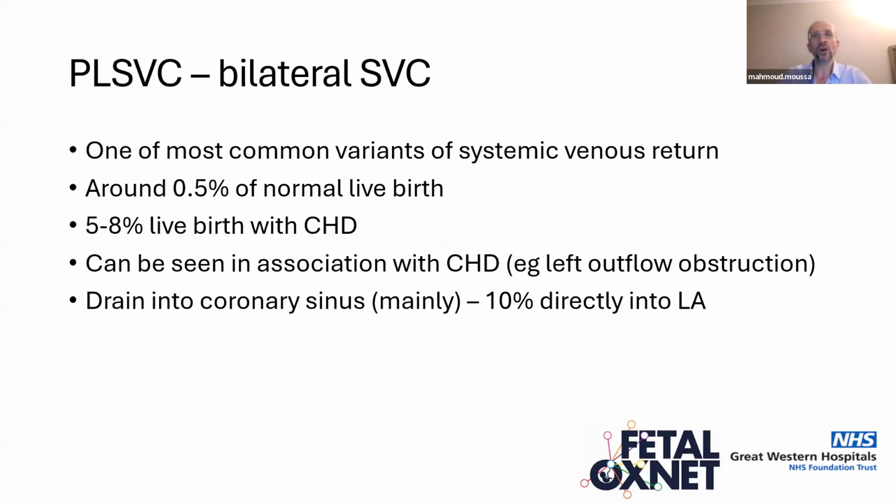So if you've got a persistent left SVC, it's our protocol in our center to see those patients later in pregnancy to check the left outflow. It will usually drain into the coronary sinus, as we said, but it can drain directly into the left atrium. And this is usually when there is a hole or a defect in the coronary sinus, usually.